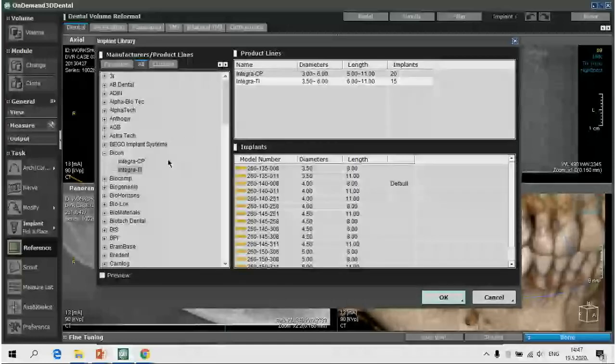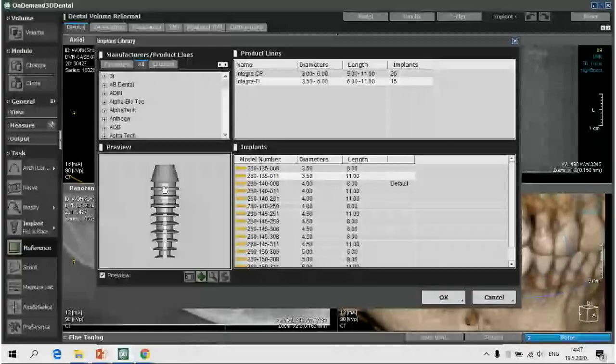But why is it important to use these fabricated or inserted dimensions? Because wherever we recognize this screw mark here, it means that we will have a picture or a preview of the chosen implant, and we will be able to orientate ourselves much more confidently and much more precisely than if we have just some kind of approximation of the implant size.